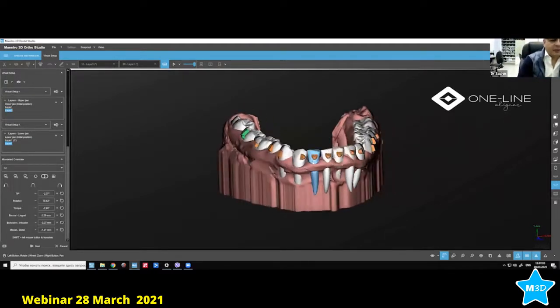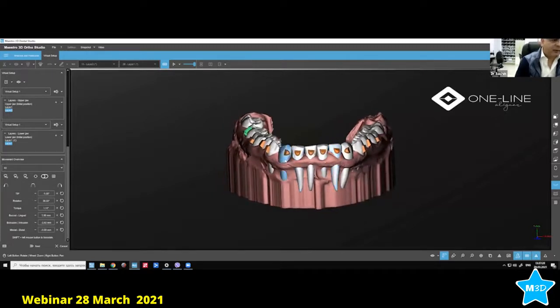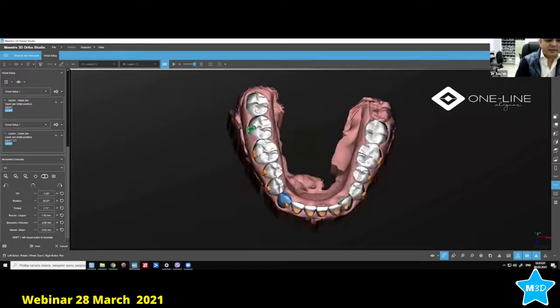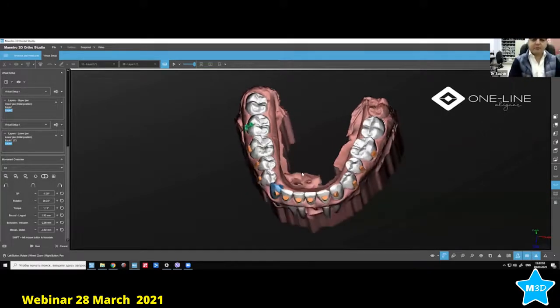So we have almost all the front teeth with almost -3 of intrusion, -3 and -3 everywhere. And then we have on the canines as well around -3 of intrusion. But we do have also a big rotation on the canine, 26 degrees of rotation on the canines. So that's why we have an attachment on the mesial side with the force going towards the mesial side. We can also add a distal lingual attachment on the canine. I think we will just see with time, and if not, then we'll do some changes with the pliers on the canine if needed with time.